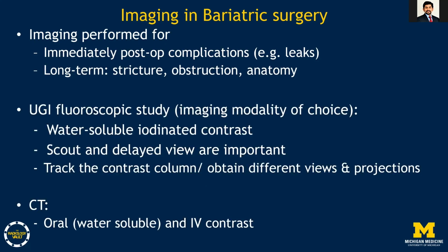When talking about upper GI imaging, upper GI fluoroscopic examination is the imaging modality of choice, as this is a more dynamic procedure where you can actually follow the water-soluble iodinated contrast. An important point to remember is that a scout and delayed views are extremely important because these can help you define if an extraluminal contrast is truly a contrast or is an artifact that has been present on the scout. The delayed views help you understand if the leak persists, and secondly, over the course of time, there is increased intraluminal pressure, which can help to better delineate any subtle or contained leaks.